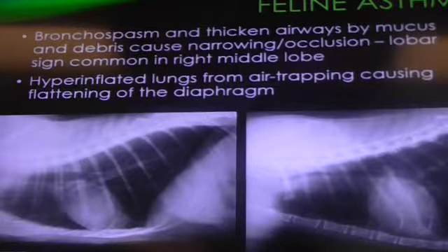To be sure, you need a VD or a DD to find out if the lesion is in the right side or the left side. Okay?